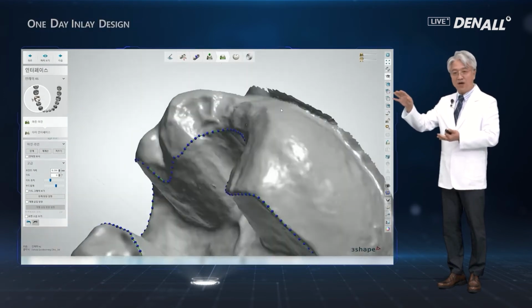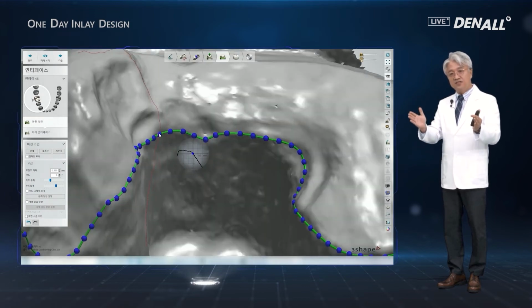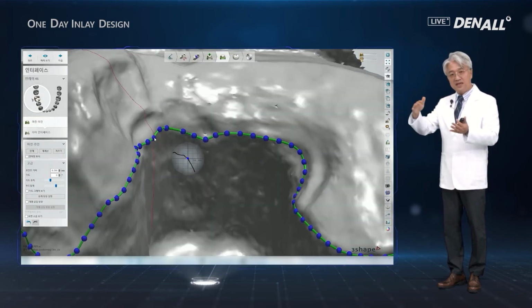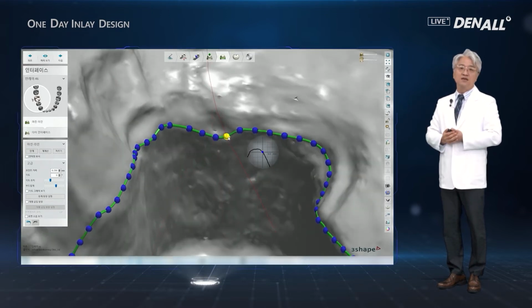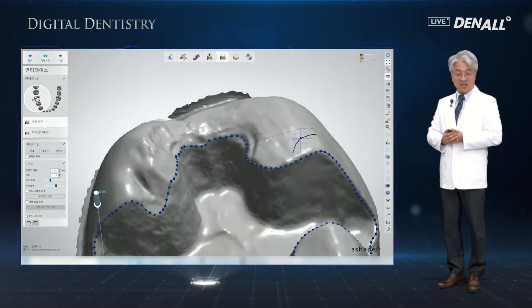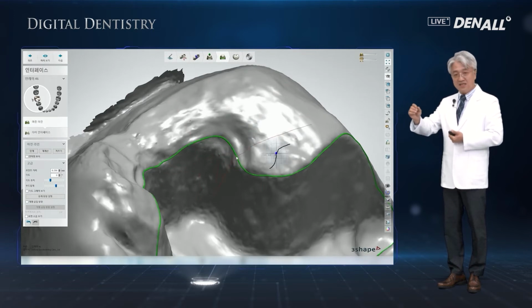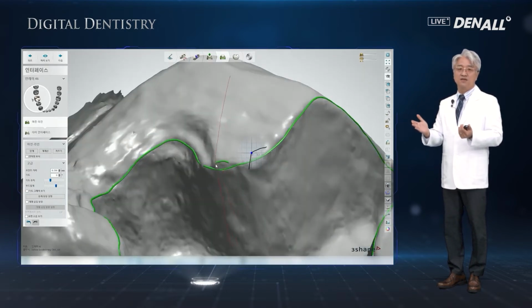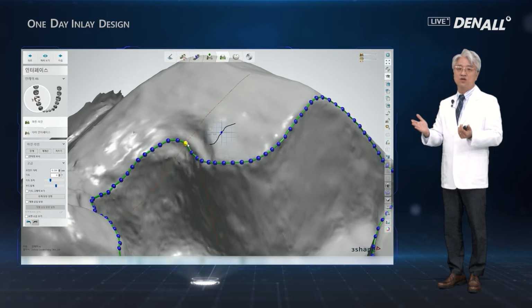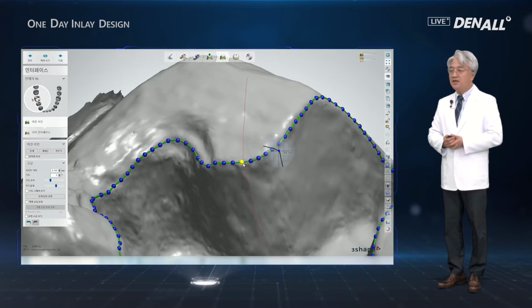But with the margin setting, with this enlarged image, the CAD system can now distinguish up to this very detailed level. It has become that precise and accurate. So the inlay that's been made with the CAD system is very precise. It clinically has very good results. So it has become a very dependable solution.